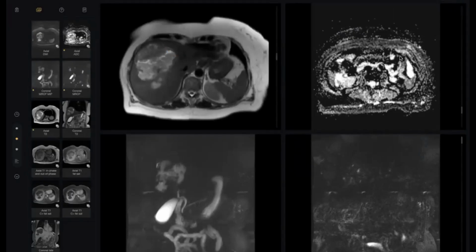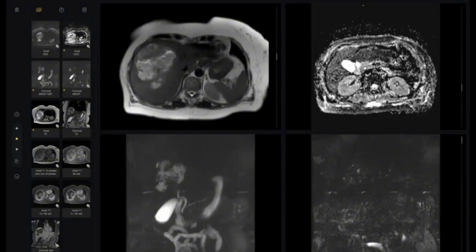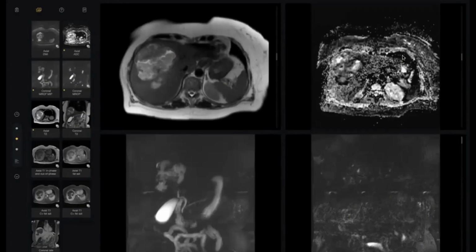If I ask you why the abscess content shows restricted diffusion, why? Because it is highly cellular. There is restriction of the water movement within the abscess itself. What is the content, please? The content of the abscess will be bacterial, with a high cellular component, which causes restricted movement of the water.